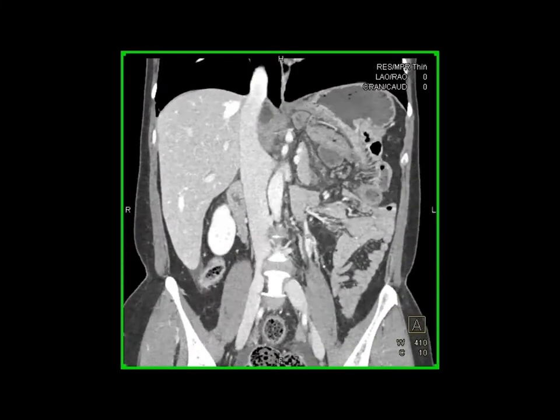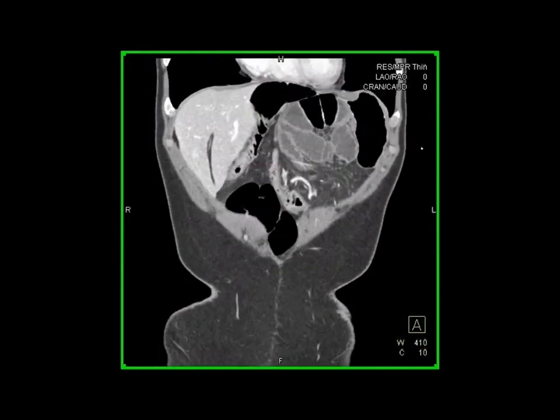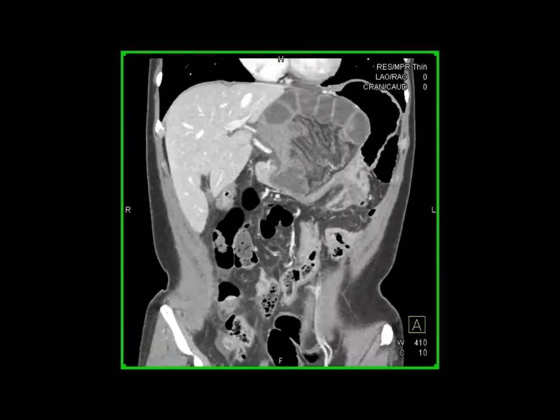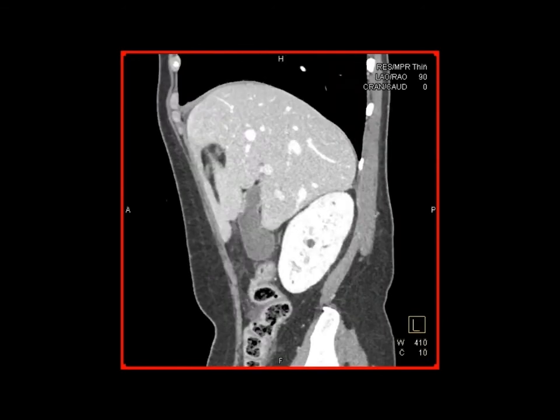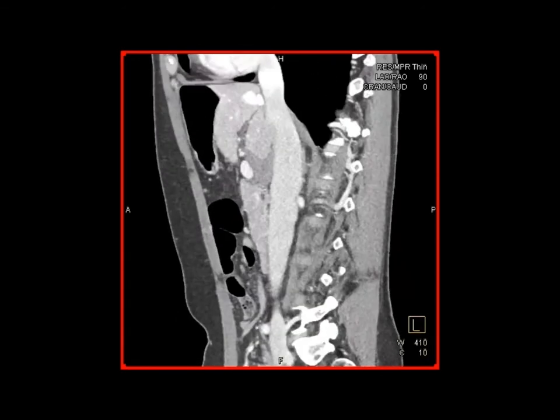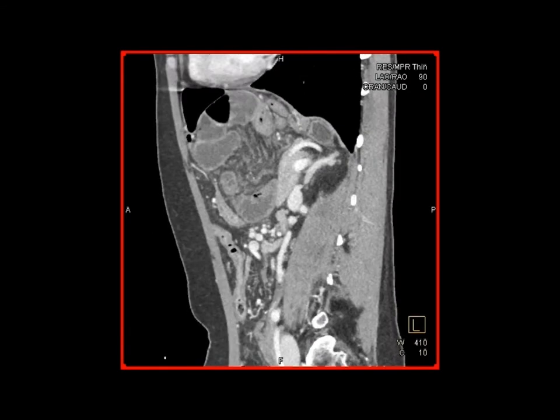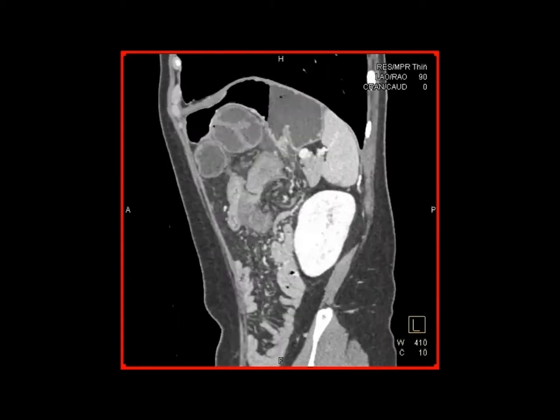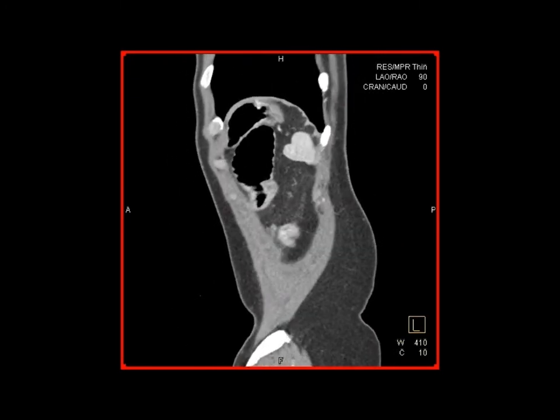and just let it scroll through. You can see very nicely the engorged mesentery, but you notice how poorly enhancing those bowel loops are, and the distal bowel enhances very nicely. That's an internal hernia. That's edema in the mesentery. And then when you look at it finally in the sagittal view, look how nicely, as we again scroll through the data, and again, this makes the point about interactive review, not just static images or slides.